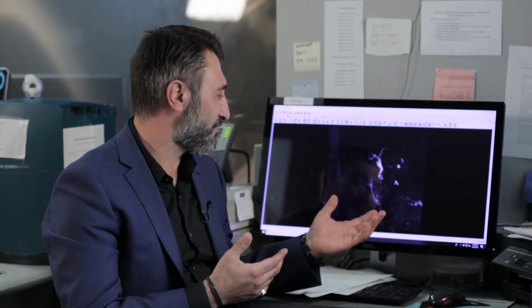So I hope we helped by showing you some images. We didn't get into a lot of detail. We'll leave that to the radiologist, but now you'll be able to tell if it's an MRI image or an X-ray image or a CT image. And with that, we'll conclude our technical portion of this part.